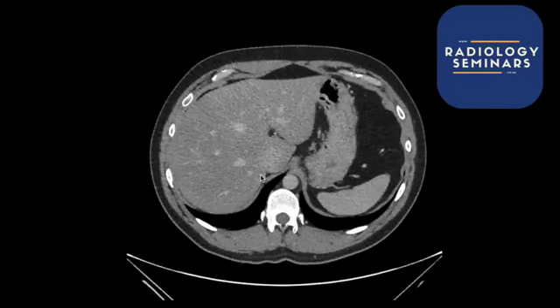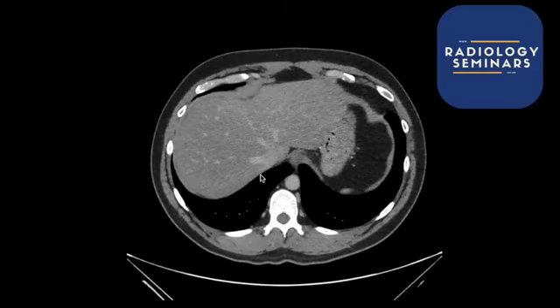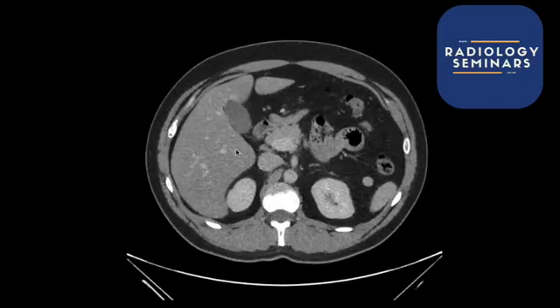My recommendation is that whenever you're looking at a CT scan, you don't just look at the first bit and stop there, thinking, oh, what's that? Is that the liver or not? My recommendation from the very, very beginning when you're starting to look at scans is to go from the top and all the way down to the bottom. So let's just do that now.